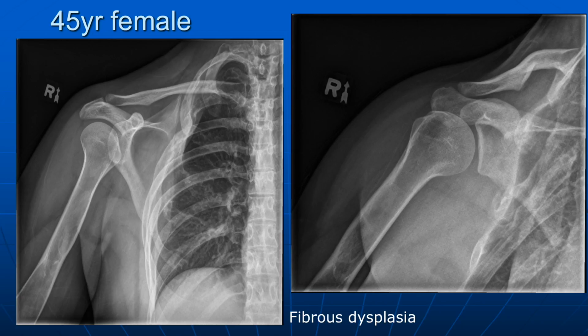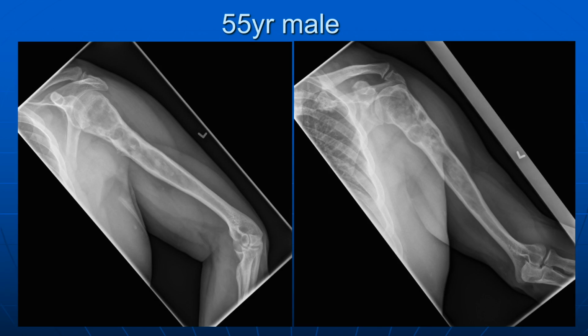That's a syndrome that gives you fibrous dysplasia and other endocrine disorders. So this patient is almost certainly going to have that disorder. You can get an isolated small area of fibrous dysplasia just as a one-off, but if you have so much involvement as this, it's most likely to be this McCune-Albright syndrome.